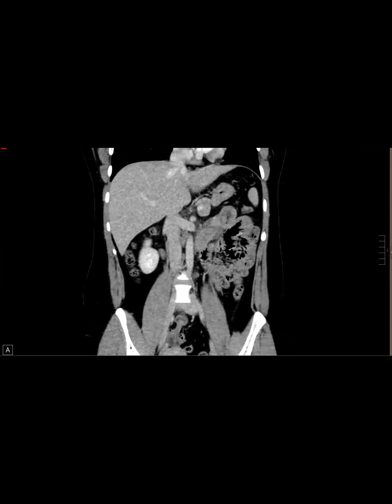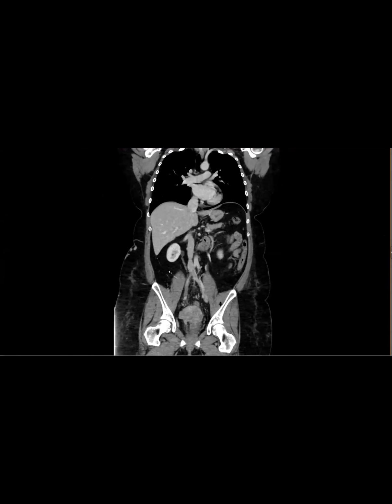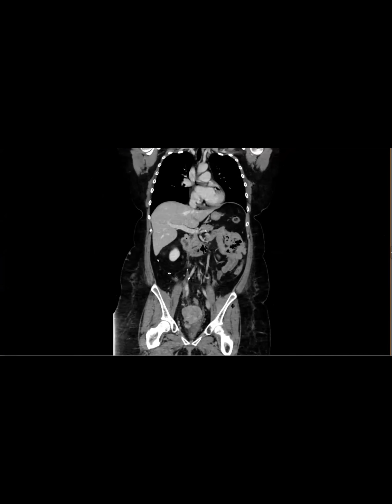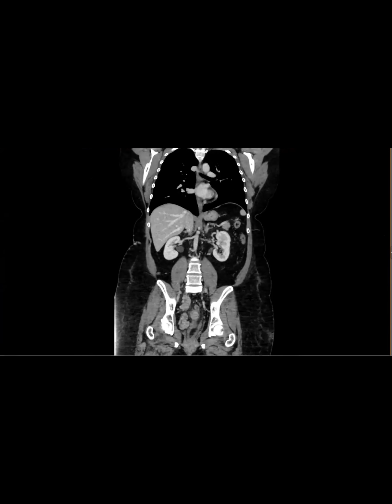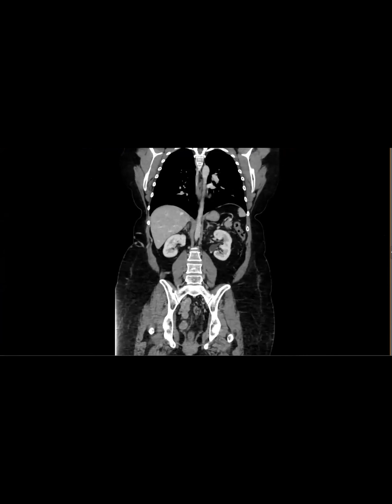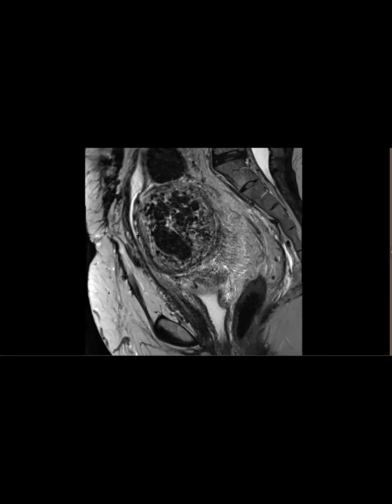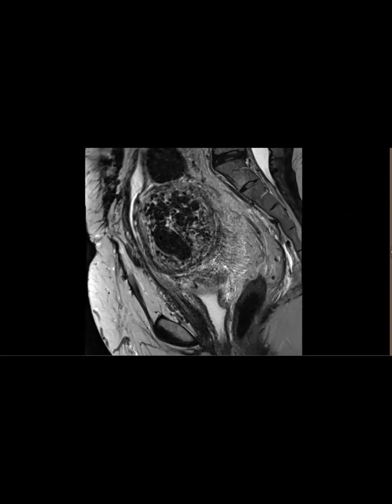Awesome. And then this is my third case. This is a patient with history of hysterectomy for leiomyomatosis. This is a post-operative CT. The patient at the time of surgery had vascular invasion and had recurrence, which was then resected. And this is a recurrence after the resection of the initial recurrence. And I'm showing this case because it's just a really phenomenal case of recurrent leiomyomatosis.